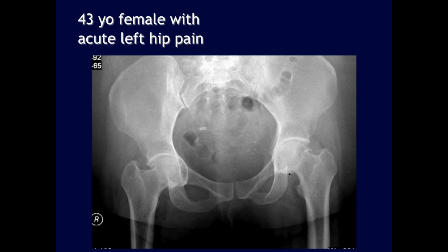I can see some marginal osteophytes and narrowing of the joint space, and there's also some right hip degenerative disease. I can't tell. There may be some thinning of that medial acetabular wall compatible with osseous remodeling. I don't see a discrete fracture on this image. There's some protrusio on the right and the left.